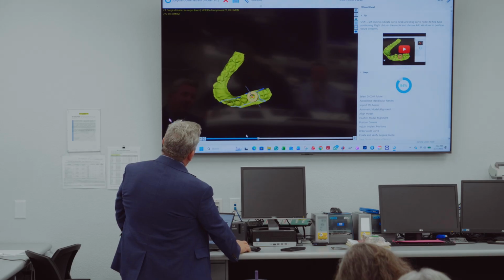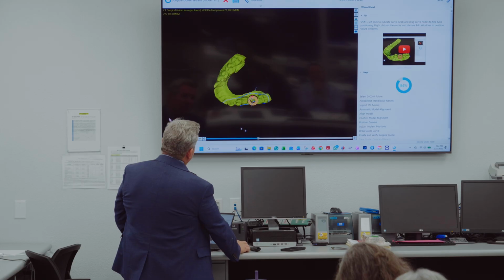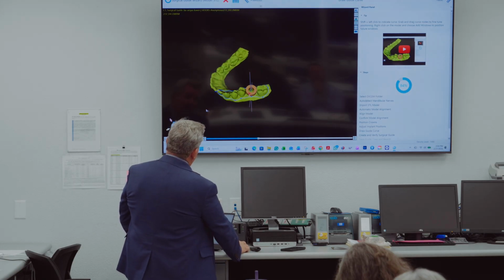All right. Now, normally, I'm not sure why I did it in this case. When Corey did it, it didn't do that, but here you might have to go back and change that and move your finish lines around. So these are the margins of the guide right here. So normally, that'd be pretty much done.